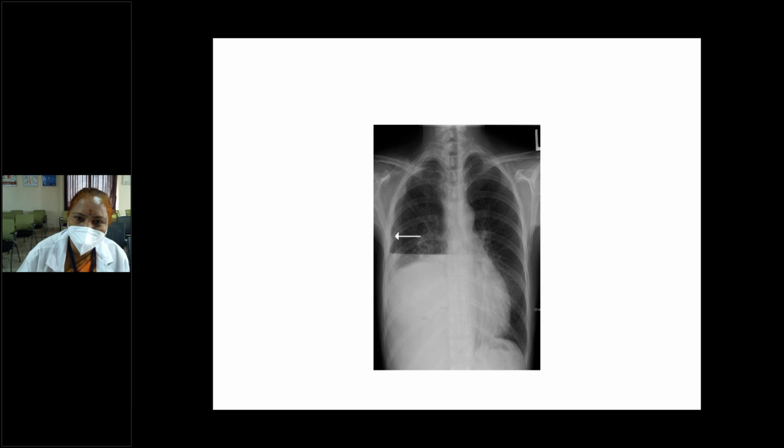Right side. This is right side. No, this is left. Okay, right-sided hydropneumo or pyopneumo with compensated left-sided hyperinflation. Left side hyperinflated. Here you can see up to this lung markings are there. Beyond that, beyond the dome of the diaphragm also you are able to see some translucency.